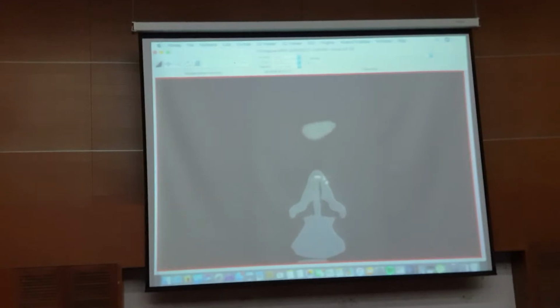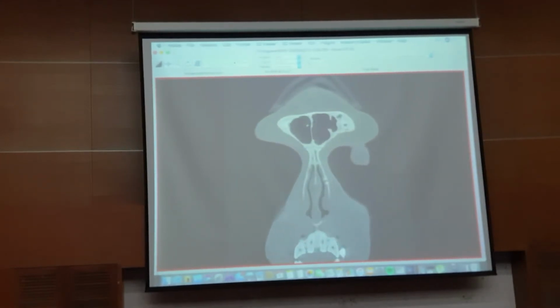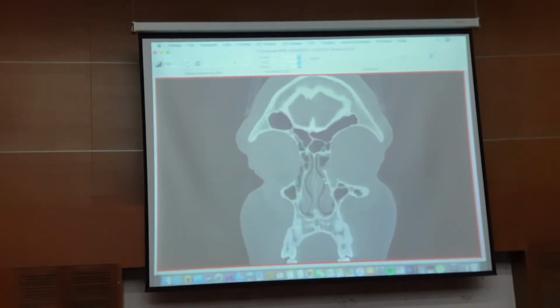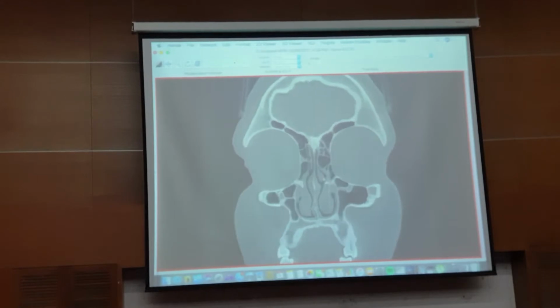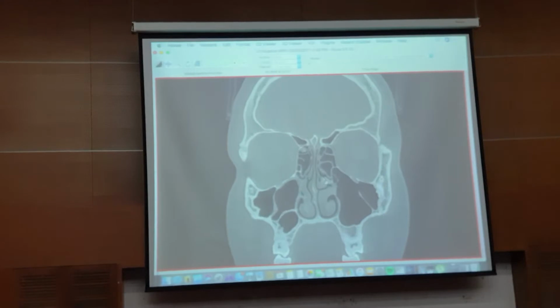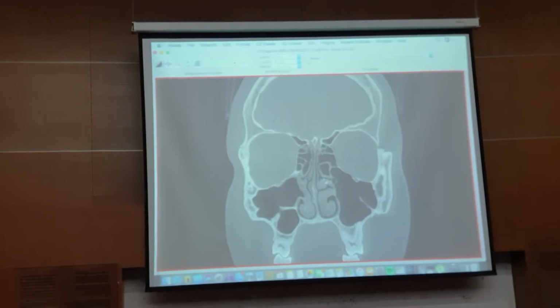Okay, so I'm just going to scroll through and you just see what you can see. Sorry, I'll get that out of the way.